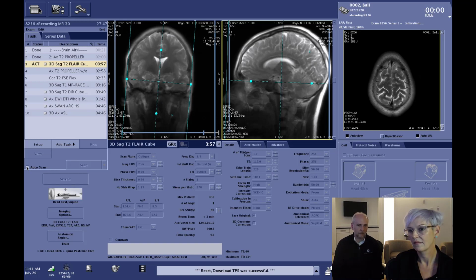Those historically have been noisy. So you're suppressing a lot of different tissues there with that. So sometimes the resolution would be low, trying to find some way to get signal there. But with this, we're able to maintain very high spatial resolution and not be so concerned about that anymore.